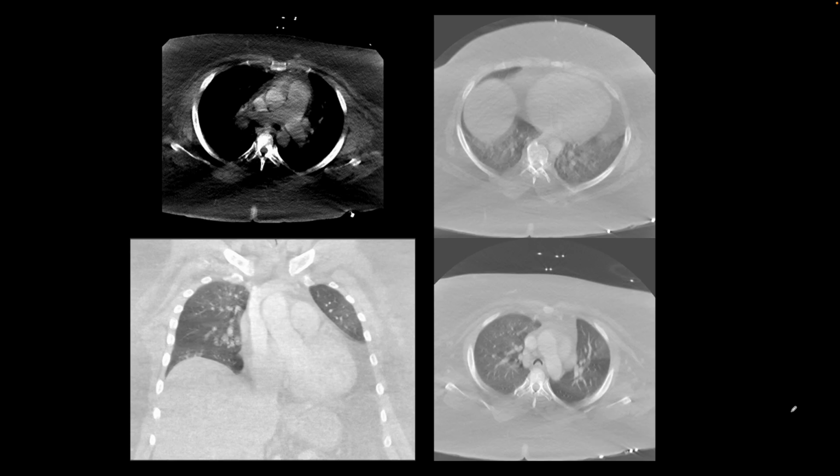And here you have to look for findings that are suggestive of obesity hypoventilation syndrome. That is the diagnosis in these patients, but this diagnosis is not made on imaging. But there are imaging findings that are supportive of this diagnosis, such as low lung volumes, bibasilar atelectasis, obese body habitus, signs of pulmonary hypertension, and collapsing large airways. So that cluster of findings should suggest to you that in this demographic, young females with a negative CT-PE study, the diagnosis is obesity hypoventilation syndrome.